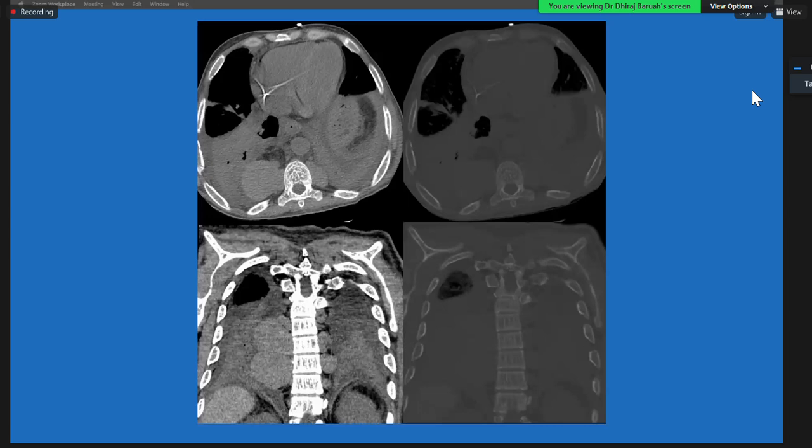So that is why it is very important to understand the cardiac borders, where they are, and if it is obliterated, what location it is, and if it is not obliterated, what location it is. So most of the time, posterior mediastinal tumors, 90% of them will be neurogenic tumors, and in some cases like this, you will have a few other differentials. So you can often make a differential diagnosis based on location, and that is why it is important to make that diagnosis based on your chest radiograph, because your next investigation may depend on your interpretation of the chest radiograph.